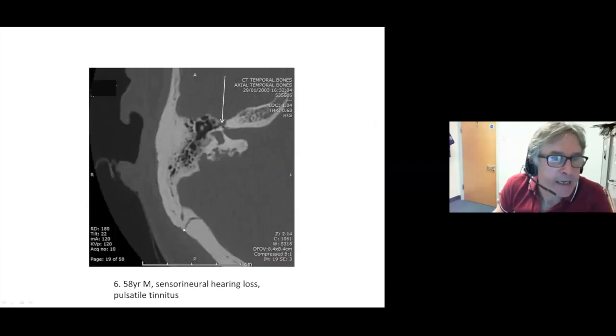And then finally, we've got this irregular area of bone destruction, rather moth-eaten looking, perhaps some little trabeculations in here. And this is very typical of an endolymphatic sac tumor. Typical location centered on the endolymphatic sac. Okay, it's associated with von Hippel-Lindau. So if it's bilateral, it's von Hippel-Lindau. But there's quite a high association. Quite a large number of patients with von Hippel-Lindau get this abnormality. And it's endolymphatic sac tumor.